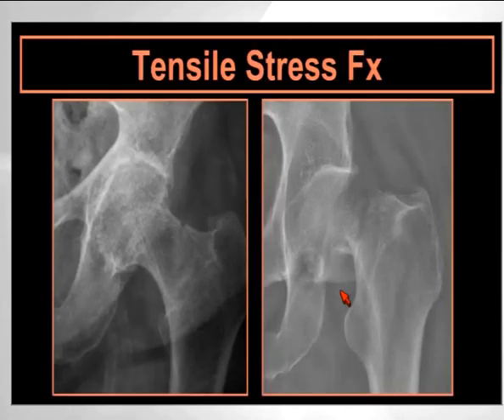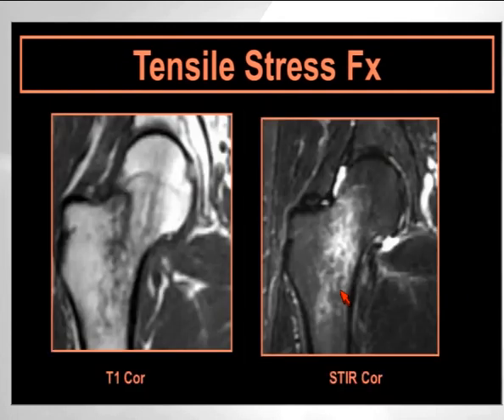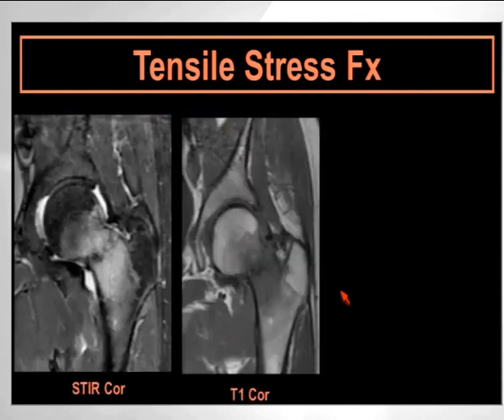Unlike this patient. So look at this. This is a tension-sided involvement. And this is just a subtle lucency involving the lateral cortex. But this fracture tends to displace. Here is another example. So we see this tension-sided non-displaced fracture. And again, radiographs were normal in this case.